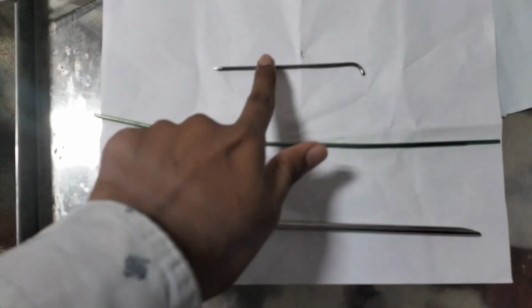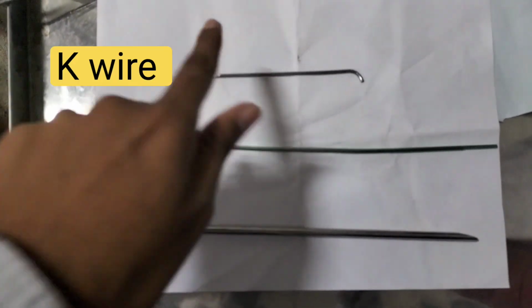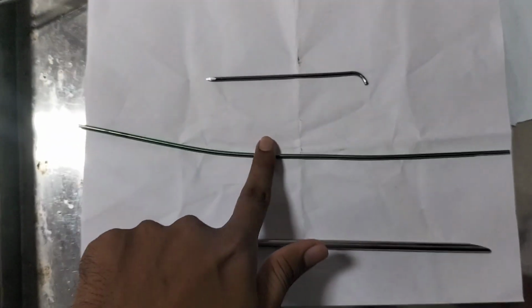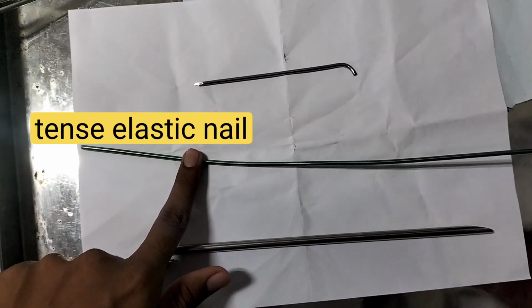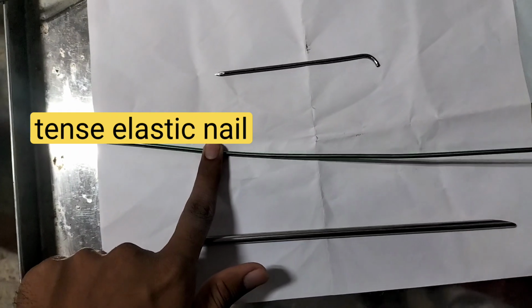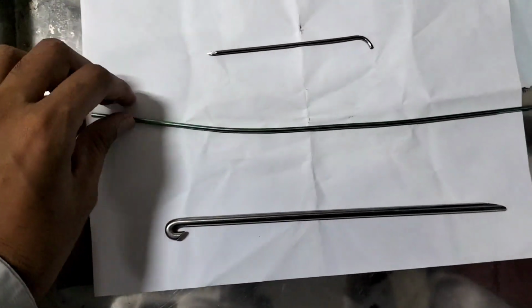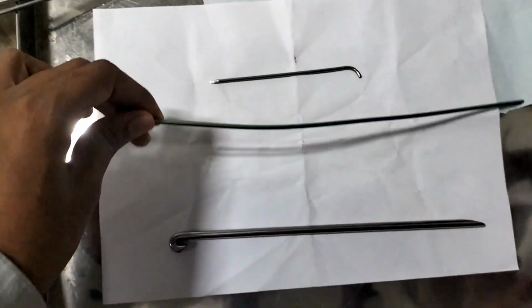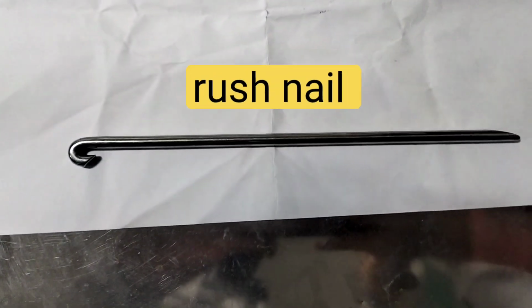Here you can see this one is the K wire. It is used for fracture at the olecranon and for supracondylar fracture. This is K wire. Next you can see this is a TENS elastic nail. It is made up of titanium. It is MRI compatible. It is used for pediatric fracture. Titanium elastic nail. And here you can see this is the Rush nail.